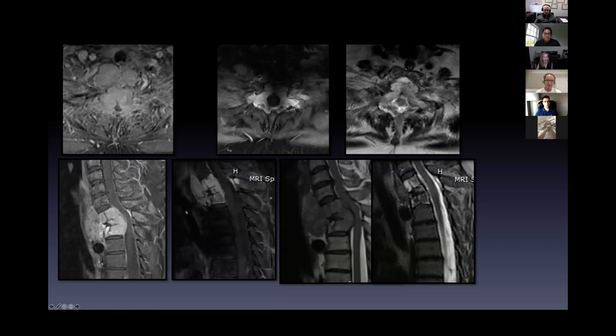So you have all this epidural extension, all that shrunk down, the prevertebral part too. This again is pre, this is post. Look at this post result. You've got an open canal now just from radiation, no surgery. Well, Wendy, that doesn't belie the fact that there's now no bone providing anterior column support.